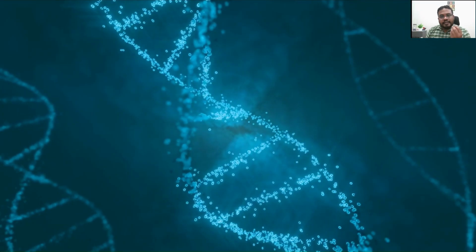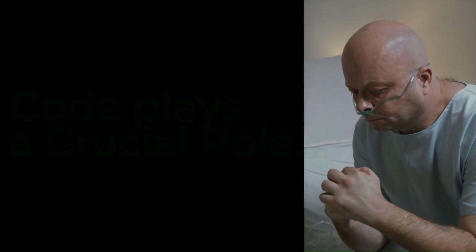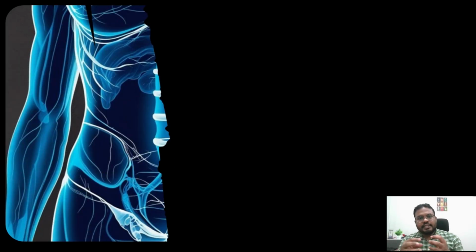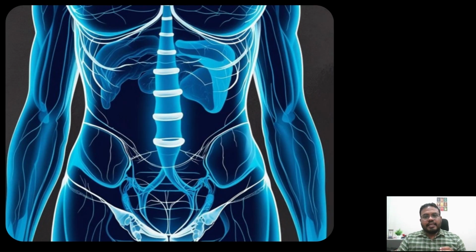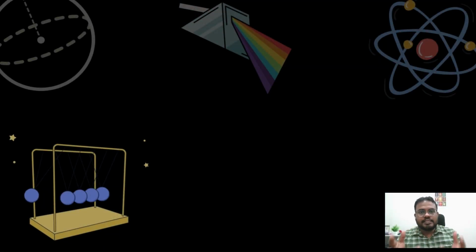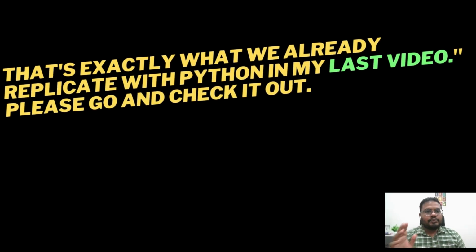We will use real medical physics concepts, transform data into images, and see how code plays a crucial role in detecting disease like cancer. CT, or computed tomography, is one of the most powerful tools in modern medicine. It captures internal images of the body using X-rays from multiple angles. These machines don't just magically create 3D images. Behind the scenes, complex calculations and physics simulations are happening, and that is exactly what we replicated with Python in my last video. So please go and check it out.